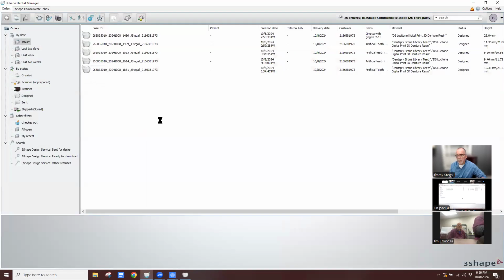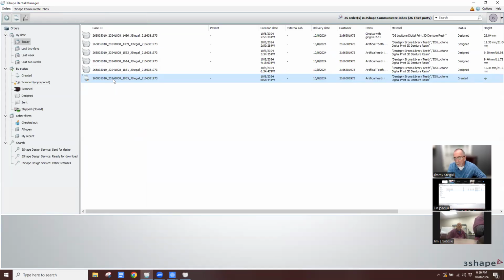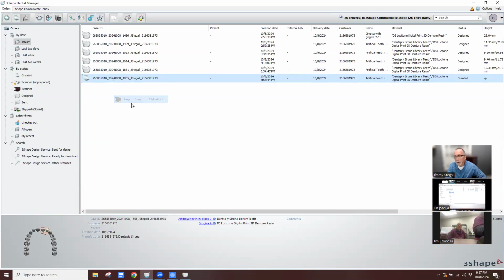So we click on OK to set the case up, once it calculates it. So you're clicking whatever teeth you're restoring. That's all you have to do. So wherever and whatever teeth they are, just click those teeth. If they have to be singles, they have to be singles. That's okay. You can print that tooth singly.